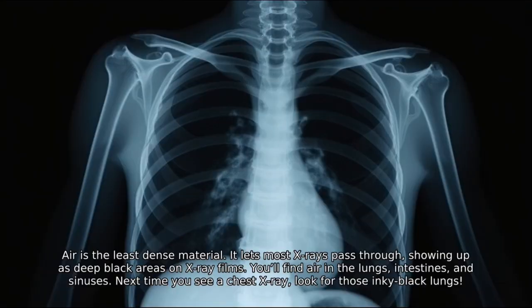Air is the least dense material. It lets most X-rays pass through, showing up as deep black areas on X-ray films. You'll find air in the lungs, intestines, and sinuses. Next time you see a chest X-ray, look for those inky black lungs.